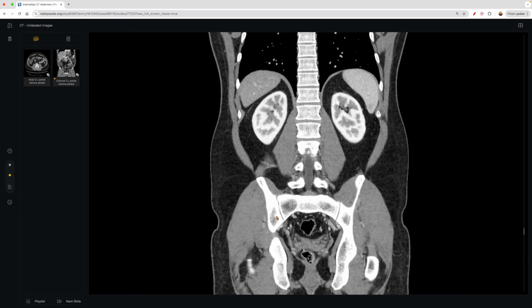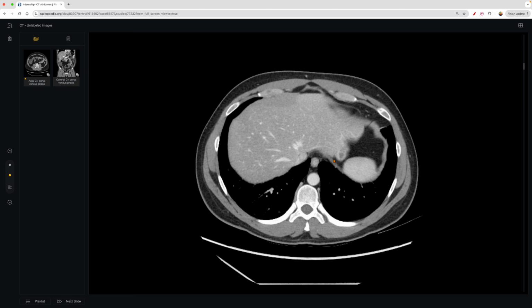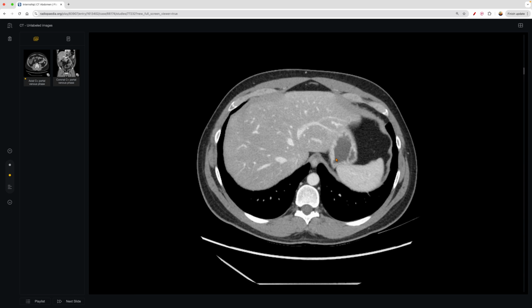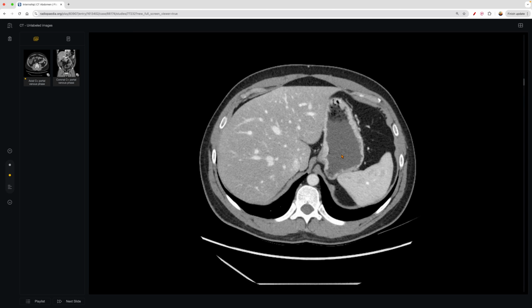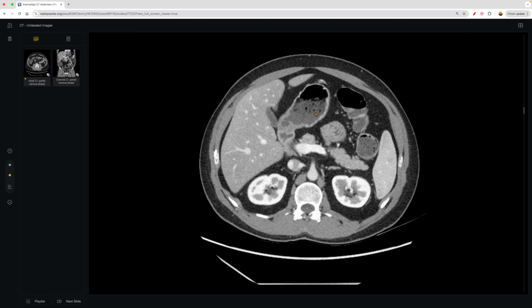And so this was a coronal, and then on the axial view, we'll start from the very top here. So we have the liver, we have the stomach, and again, you can appreciate that gastroesophageal junction as well. Again, important for identifying hernias. Patient with gastric contents, perfectly fine.